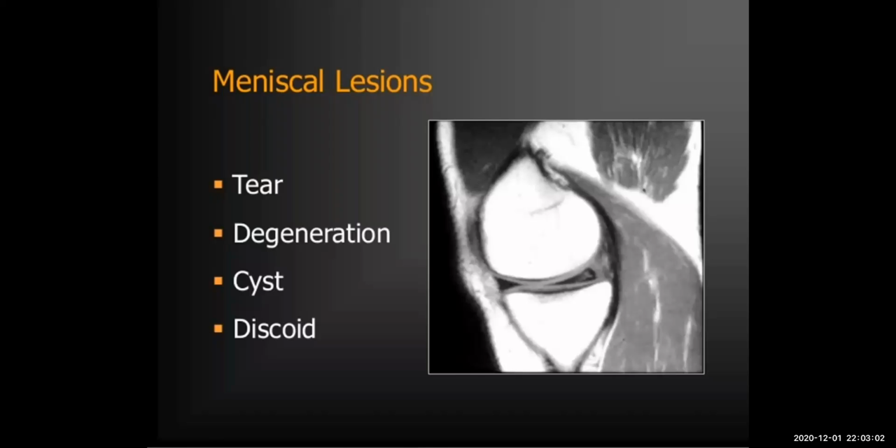This meniscus will be pinched between the femur and the tibia, so the traumatic tear could be there by far. Again, the degenerative tears: the medial side has high stresses and accommodates a load, especially in varus knees or heavy weight patients.